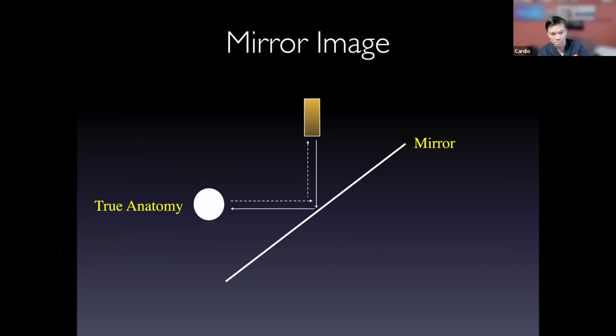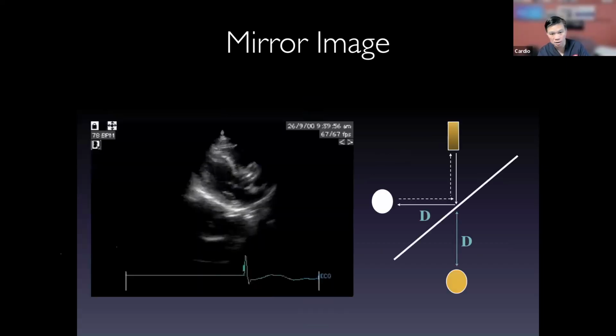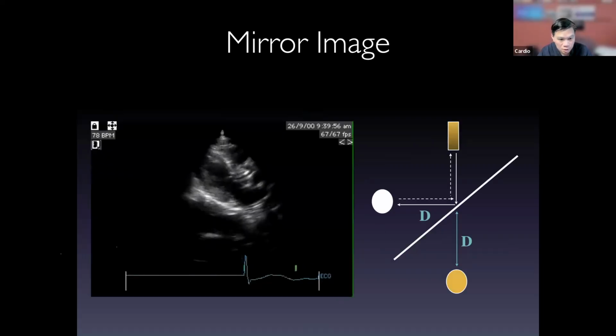So this is actually the schematic, and you've seen that already as a double aorta. The other very common feature is a mirror artifact in a parasternal long axis. So let's see if this thing moves. There you go. So you see the mitral valve here beyond the posterior wall or the pericardium. The pericardium is a specular reflector. The difference between a specular reflector and not is that a specular reflector is like a mirror, where the undulation or the particle size is smaller than the wavelength.